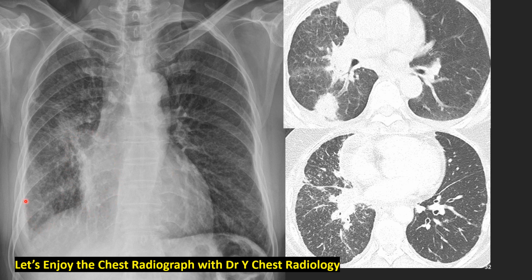And what about these areas with pleural effusion, interlobular septal thickening, Kerley lines, and we see many small tiny nodular densities. So we describe this as reticular nodular pattern. Reticular only is not so miserable. But when we say reticular nodular, nodular means malignancy. So reticular nodular is not a good pattern. Let's compare with the left side. The left side is relatively normal, not absolutely normal.